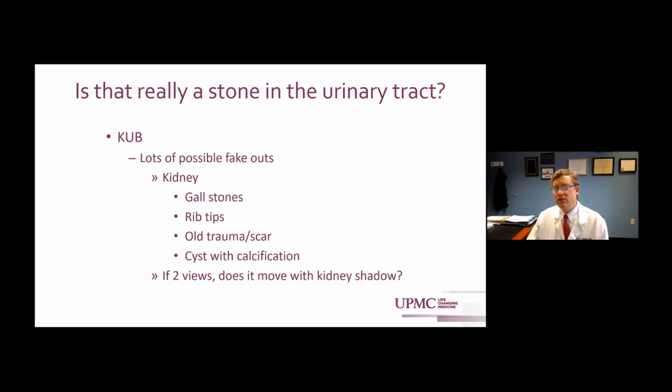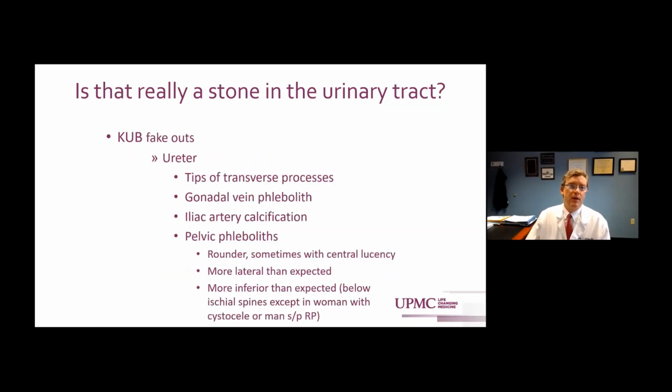If there's two views, sometimes they were taken with different levels of inspiration, and you can see if that one travels. If there's a question, something you think is in the bowel, if it seems to travel with the kidney, then it's more likely in the kidney. And of course, if not, then it's almost certainly not in the kidney. Fake outs on a KUB in the ureter, tips of the transverse processes of the spine, as well as vascular calcifications.